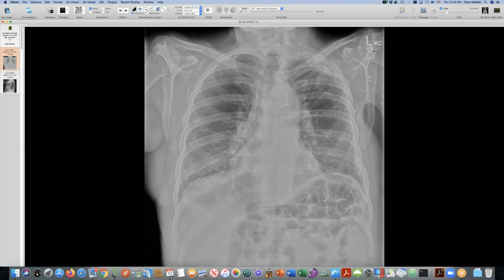And when I saw the current chest radiograph, the first one I showed you with all of that bone destruction, and it goes through and through from anterior to posterior, you know that this is something that affected that region, and it's through and through radiation that did it. And everything in that path has crumbled and been destroyed. So it started out with osteopenia. About 20 years out, it was osteopenia, and he had at that point lymphedema, probably from obliteration of his lymphatics and things like that. But now it's progressed to radionecrosis. So this is radionecrosis.